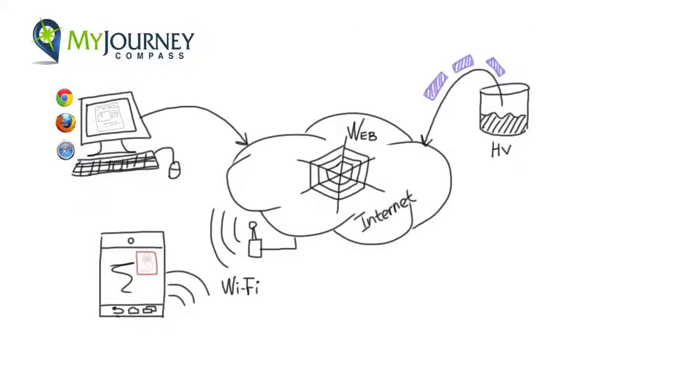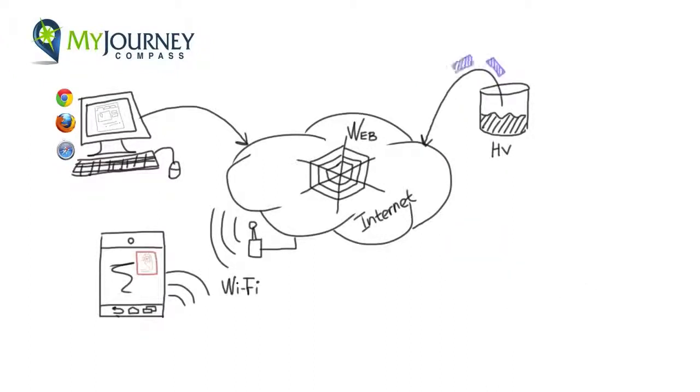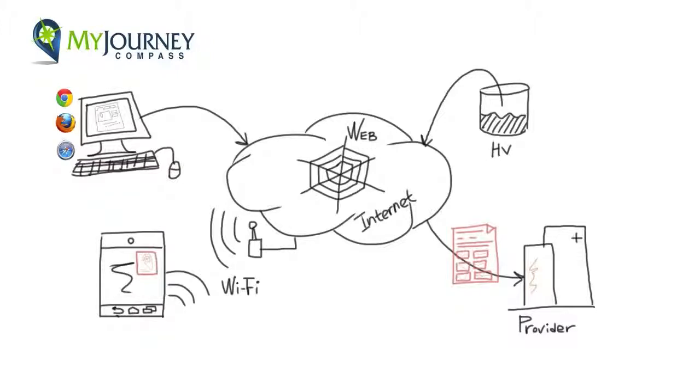Patients tracking their symptoms can use the web-based application to read their symptoms and generate a symptom report. This symptom report can later be sent to their provider.